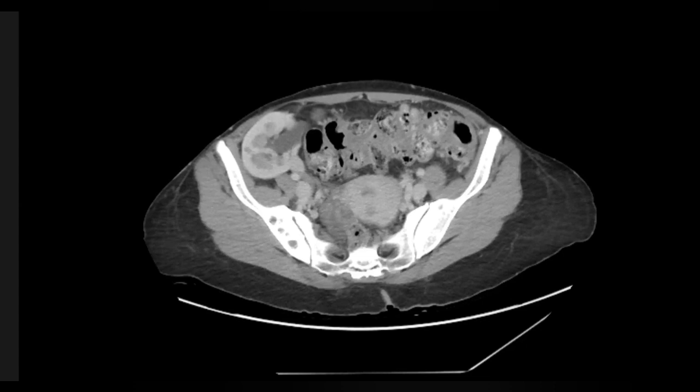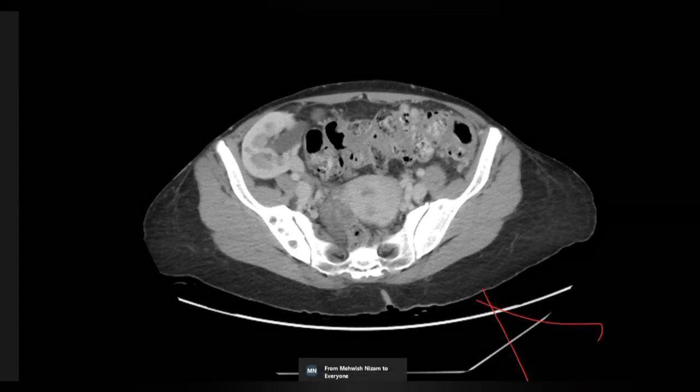This case is so simple. The colon is dilated and appears thick-walled, and there are also air lucencies in the colon. So my diagnosis is colitis. No, colitis secondary to what? As there is a history of transplantation, the patient might be receiving some immunosuppressant, so it can be neutropenic colitis.